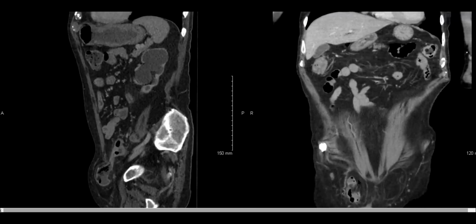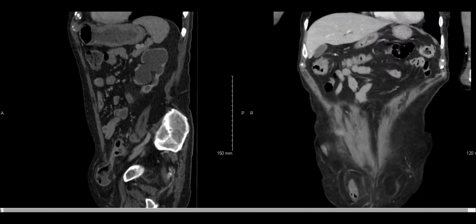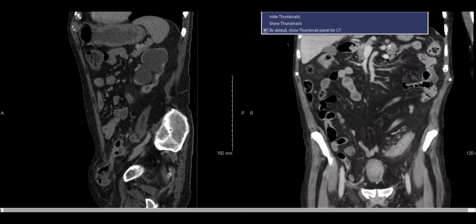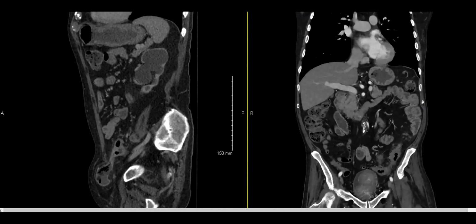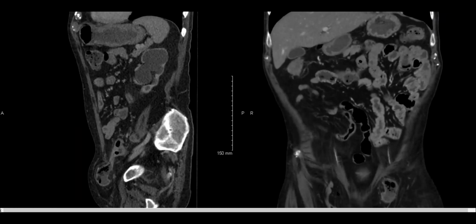It looks very similar, but here you can see follow the bowel loop in, and follow the bowel loop out. But on the other side, even though it does look similar, it's not quite the same because it's not a loop technically.